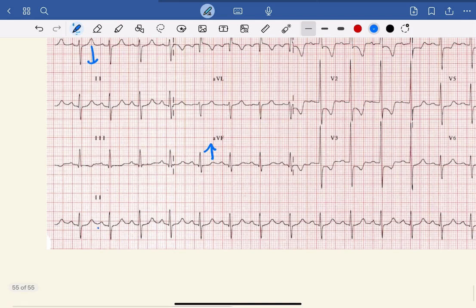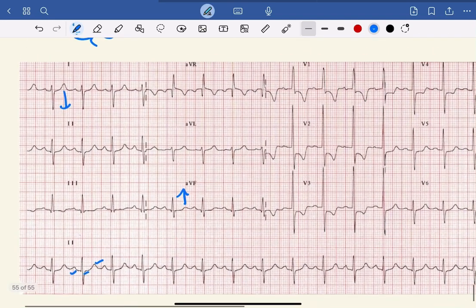The P wave is normal, QRS looks normal, T wave looks normal in lead 2. Next you see lead aVR. What happened here? There is predominant R wave. So dominant R wave in aVR, that is one criteria to call it as RVH, and there is right axis deviation. So this is first criteria, dominant R wave is second criteria.